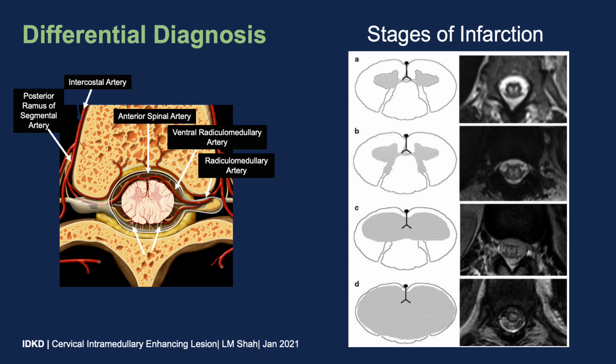The anterior horn involvement with spinal cord injury is reflected by the fact that the anterior spinal artery supplies approximately 2/3 of the spinal cord. Abnormal intensities in spinal cord ischemia typically start in the region of the anterior spinal artery and spread to the adjacent white matter. The patterns of MR signal abnormality with increasing changes reflect a temporal sequence of ischemic changes. We may see them involving the gray matter and eventually involving the entirety of the spinal cord. Often the MRI appearance is a mixture of patterns.